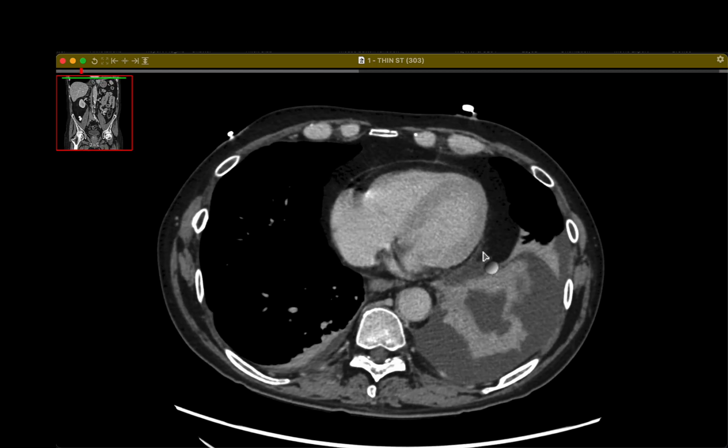Most commonly, this results from trauma with splenic rupture and seeding of the pleura. It can happen with diaphragmatic injury, but doesn't always occur. Even small injuries are enough for the splenic tissue to implant. And it usually will follow the other splenic tissue on different phases of contrast.